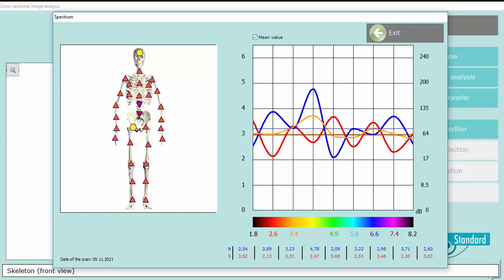The newly created yellow curve forms the middle value between the blue and the red curve. We see both the anabolic and catabolic states in the curve, but we also see that the highest point of the yellow curve is at 4.2. The highest point in the spectrum means that for this specific cross-sectional image, the biggest occurrence is taking place at 4.2. This means that in relation to the skeleton, the largest imbalance exists at 4.2.